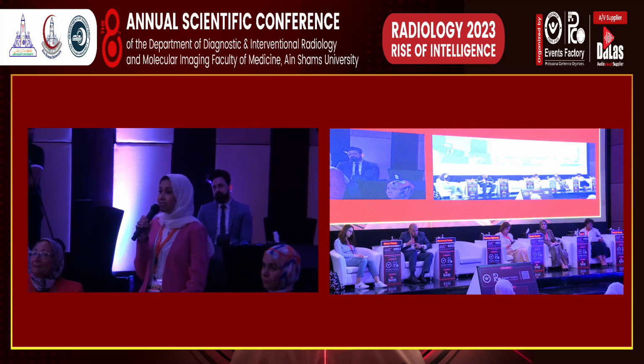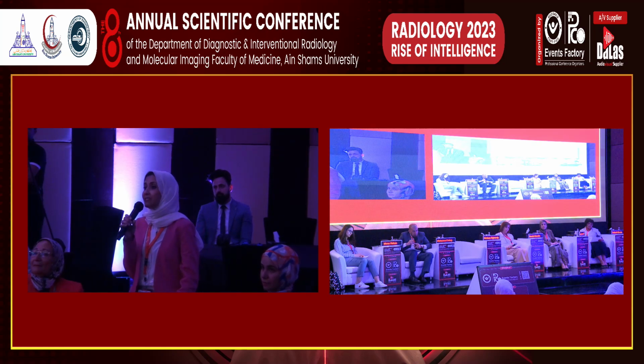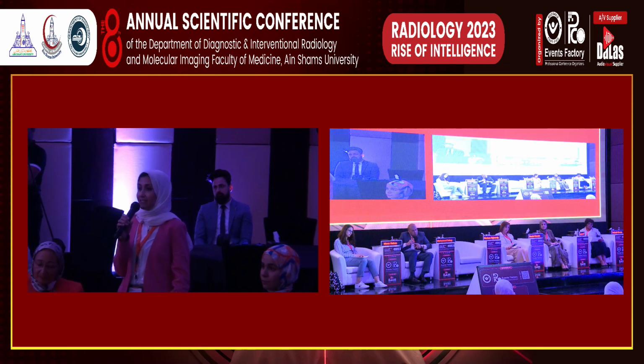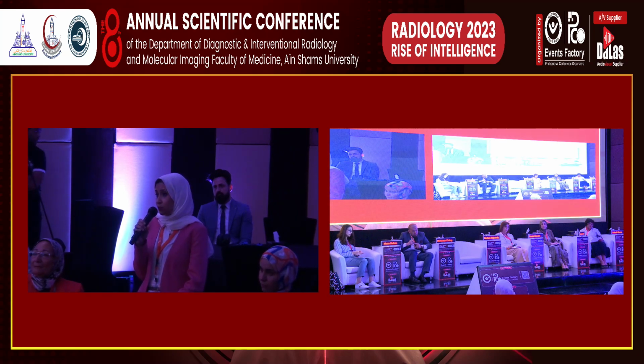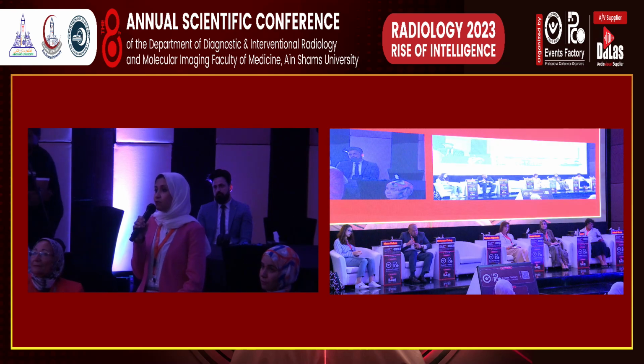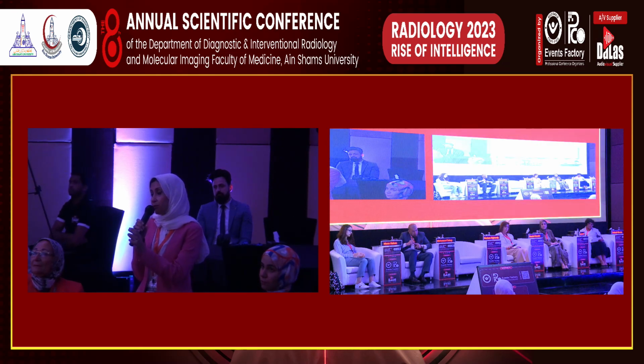الحل التاني معايا ان انا باخد للعيان حاجه اسمها ديليد ايمجز، بقعد العيان ساعه وبعد كده بدخله يتصور تاني على المكان السسبيشس اللي انا شاكه فيه. ليه؟ اللي هيحصل انه زي مثلا الحاله اللي انا وريتها اللي هو العيان بتاع اليورينري بلادر دايفرتيكولر تيومر، الاف دي جي افيديتي النورمال اللي هي ماشيه في الباث واي النورمال بتاعها هتتحرك، مش هتفضل ثابته في المكان.